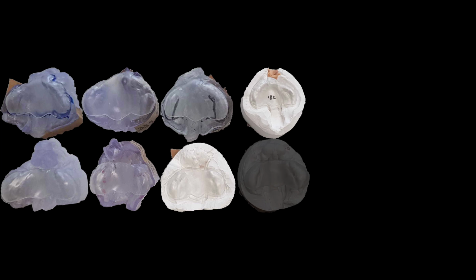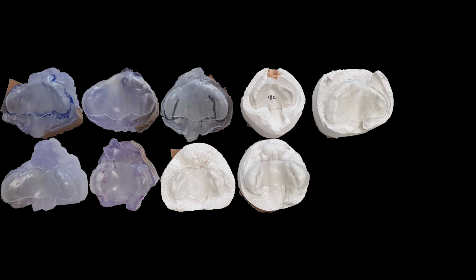We evaluated our pipeline's performance on the following 12 printed models. 6 are unilateral and 6 bilateral cleft lip and palate. An orthodontist and a surgeon assessed all plates as suitable for patient use in most cases without requiring any subtractive adjustments. Finally, several patients are already undergoing treatment with our automatically generated plates.